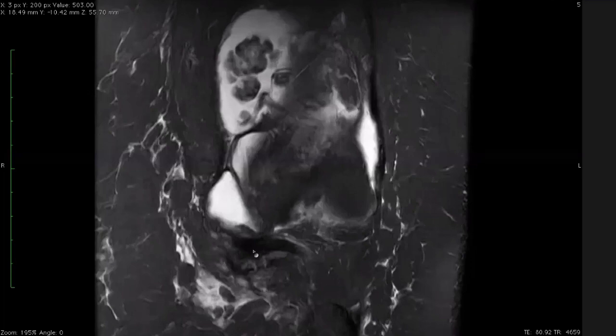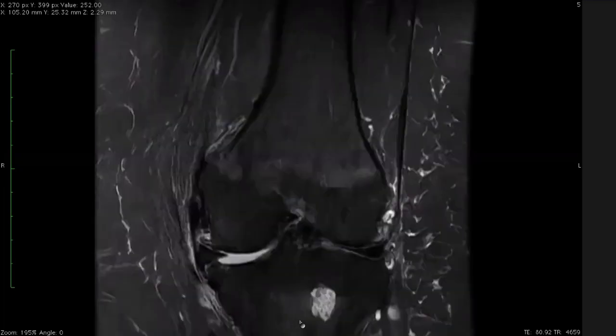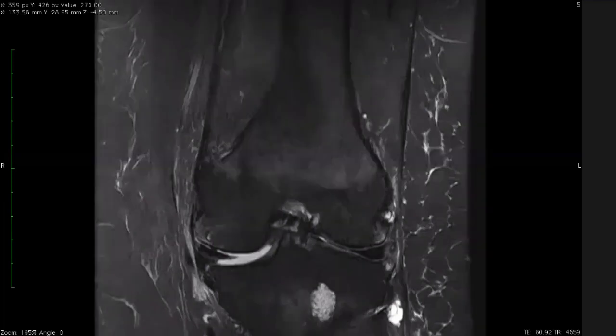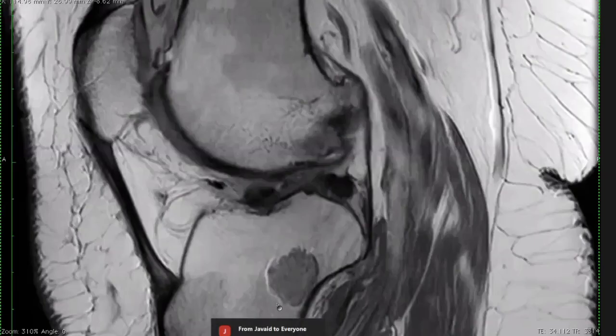That lesion there that we are seeing in the tibia. Any thoughts about that? It is intramedullary. Yeah, it is in the bone. But what's the shape of it? It is an intramedullary lesion, and it is kind of lobulated in appearance. It is not in a subarticular location. It's quite away from the subarticular space. I mean, subarticular means it should be somewhere here. And it is near the physis. The margin is bright on this PD or T2 weighted image.